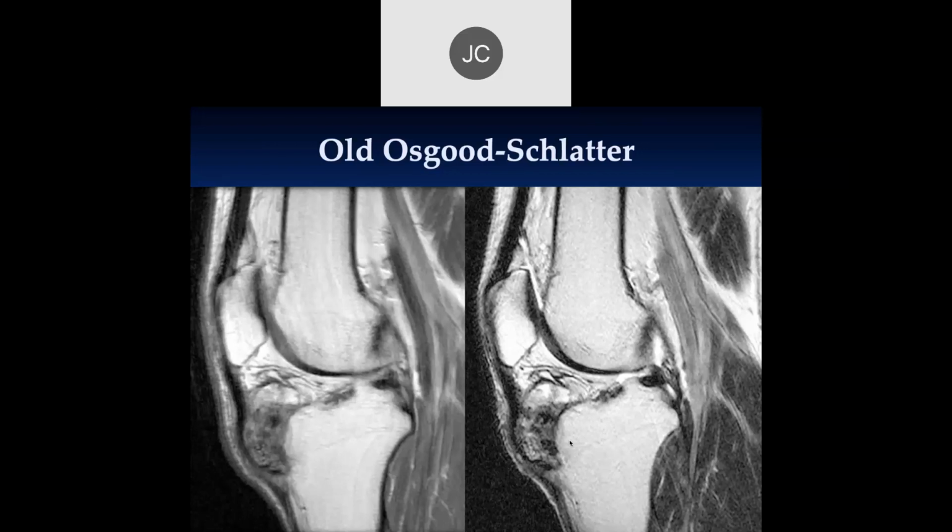Looks a little different. So I'll show a different number of these because they can all look a little bit differently. It's also causing patella baja because it's pulling the patellar tendon distally by pushing it anteriorly.